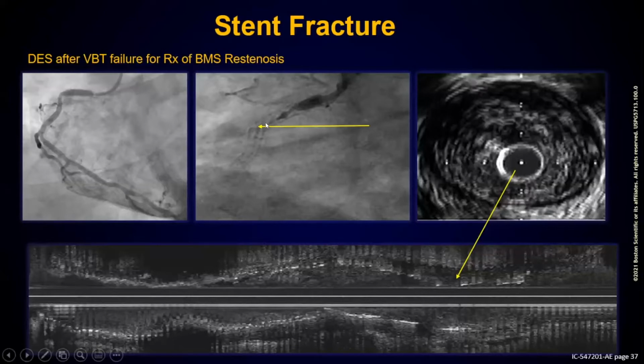And you could see that on this stent boost, usually a simple rule of thumb is that when there's a gap between the stent struts, that is stent fracture. Different people will just say, oh, this is stent fracture. You have to prove it on IVUS or angiography. And here you could see that not only longitudinal, it has been demonstrated there's a gap of the stent struts, but also here we see underneath on the IVUS as well and on angiography.